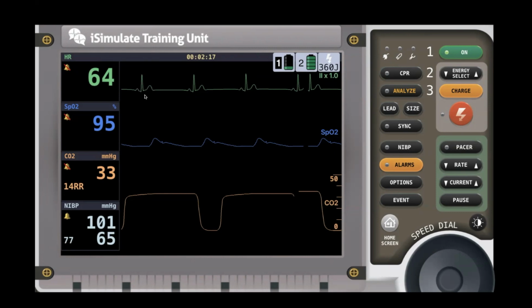That's a good thing. And as a gee whiz thing, anytime you see the squiggles up here and you're feeling for a pulse, your eye should go right down to these pulse ox pleths. When you see this pulse ox pleth here, this should be associated with this. This lets you know you have pulsatile or mechanical function of the heart. So it has enough mechanical function to generate cardiac output or a pulse out to wherever this probe is, probably in the finger, the farthest point from the body.